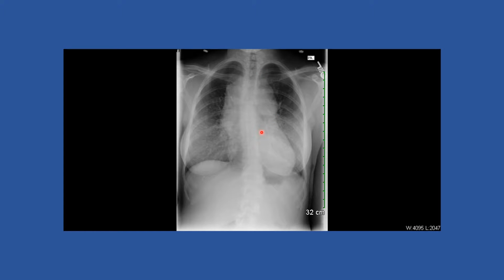That is an abnormal finding, and unfortunately it can be a rather ominous finding. So in this particular case, we got this woman evaluated by CAT scan very quickly to try to confirm or dispute some kind of a lymphoma. And in fact, she was diagnosed with a lymphoma. So always keep in mind that you're looking at the entire x-ray. You're not just looking for pneumonia or heart failure.